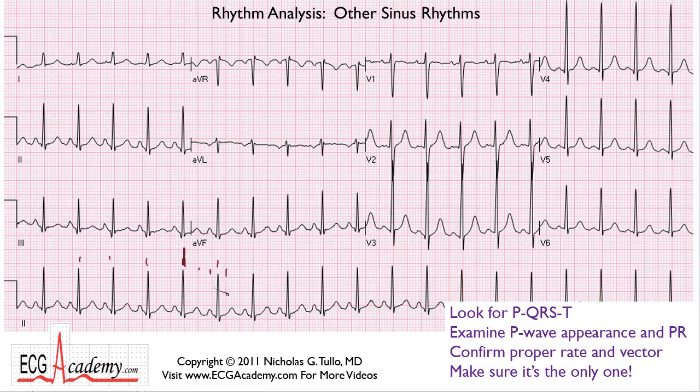So here's what I'm talking about. Start with this one, ignore this QRS complex, and ask what the rate would be if it's here. We count off 300, 150, 100, 75, 60. So if these 2 QRS complexes were there, the rate would be 60, but since there's one in the middle, that gives you a rate of 120. Look at that, how easy. The key is to just measure off 2 R to R intervals, calculate what the rate would be, and then double it. That's a quick and easy way to get a more accurate measurement of heart rate when your QRS complex lands in between 2 heavy lines.